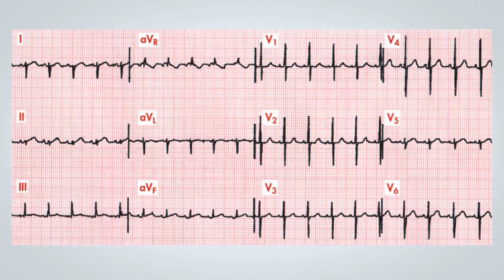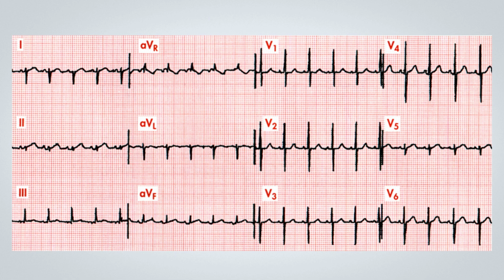Take a look at this electrocardiogram. We know that the following patient is healthy, but why is she crying? What is your opinion on it? To reinforce the question, why is this healthy patient crying? I recommend pausing the video to carefully analyze this ECG before continuing the discussion.